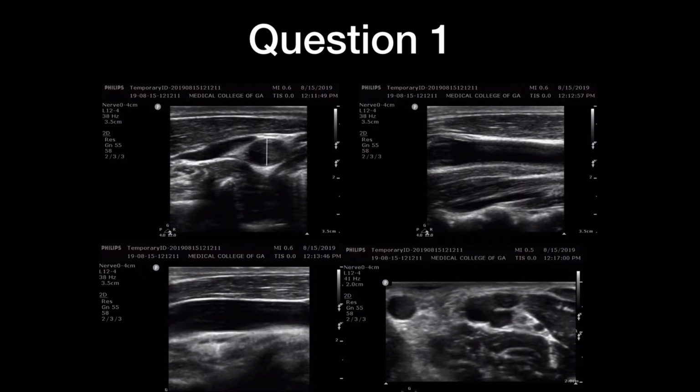We'll go on to the post-lab assignment. Question 1 asked you to post your 4 images. And so that's what the 4 images should have looked like. You should see the carotid artery and internal jugular vein in short axis, and then images of the carotid and IJ in long axis, and then 1 image of the brachial artery and brachial veins.